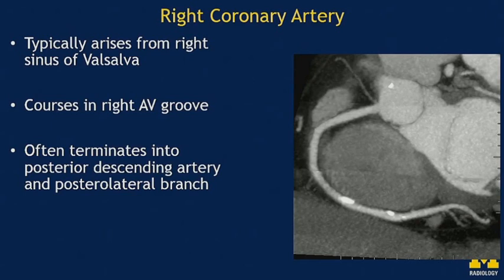And following me, Dr. Seelan Javedan is going to talk about coronary anomalies. So what you'll notice is that the vessels can arise from the wrong sinuses, but what's very important is the dependent territory. That's how we name a vessel. So what that artery is supplying is the reason for naming it as a right or a left coronary artery.